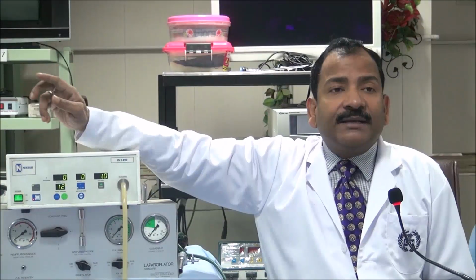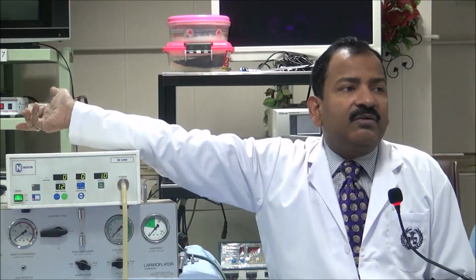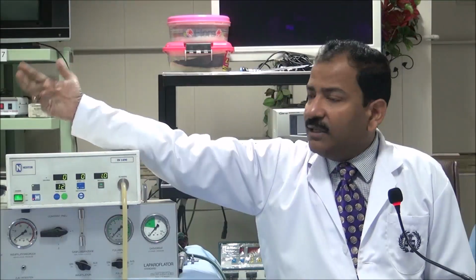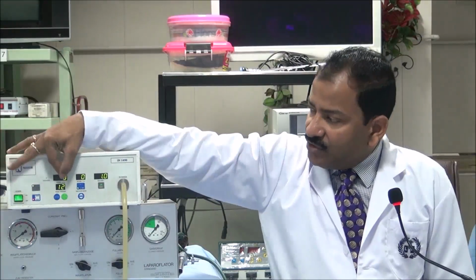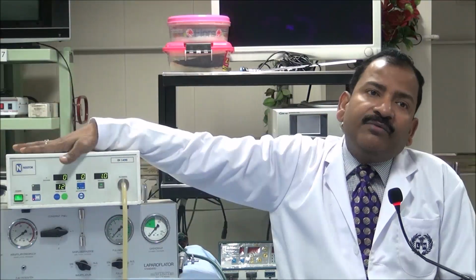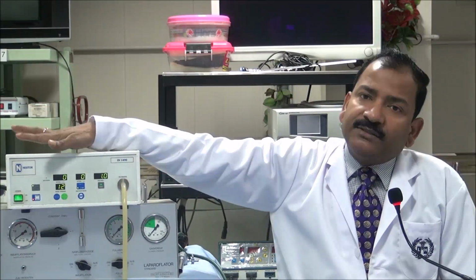And if you have done a nice suction irrigation and hanging drop test, then during irrigation itself you will know that blood was coming. But if you didn't do that, then it can start with the gas. So this is called the Quadro manometric indicator. This is a beautiful machine which can immediately let you know where your gas is going.